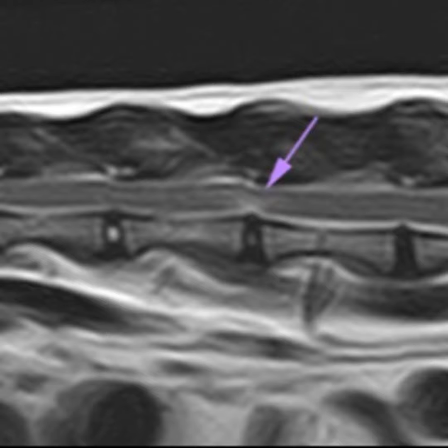So the aspect of the intervertebral disc, so the reduced signal on T2 and the extension of the intramedullary hyperintensity. So this is a critical point of our study, because sometimes it's difficult to differentiate between acute non-compressive and ischemic myelopathy. Right.